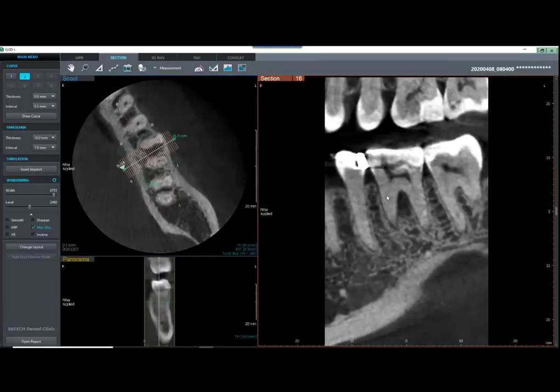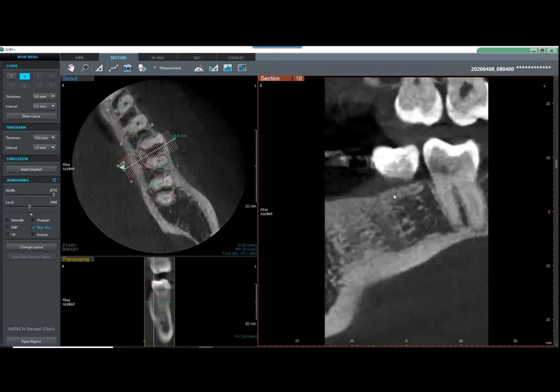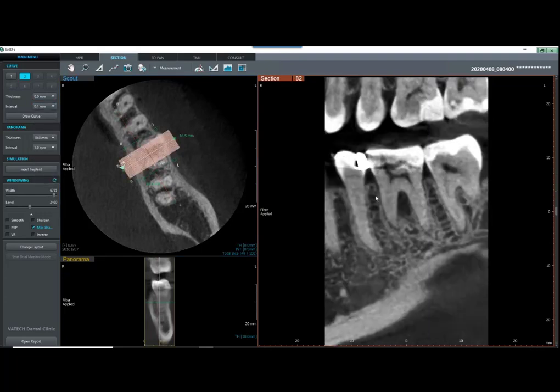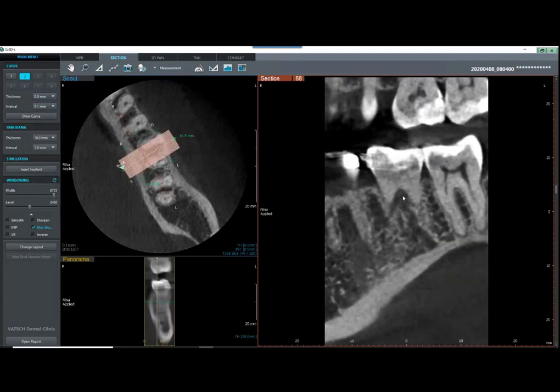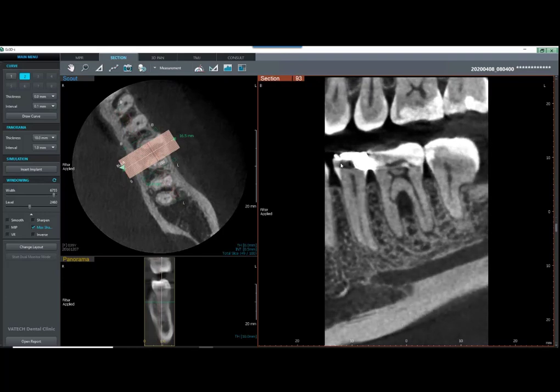Now we have more of our, I'm going to call it our sagittal slice. We can scroll across. I'm going to go ahead and change my intervals down to a tenth this time. And come across here. So my question would be, let's put an annotation there, right there.